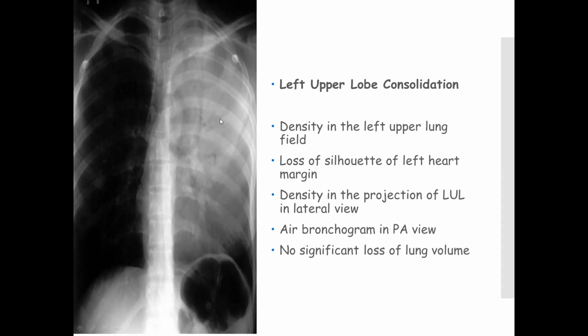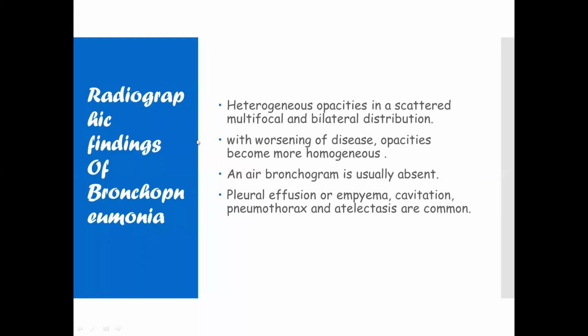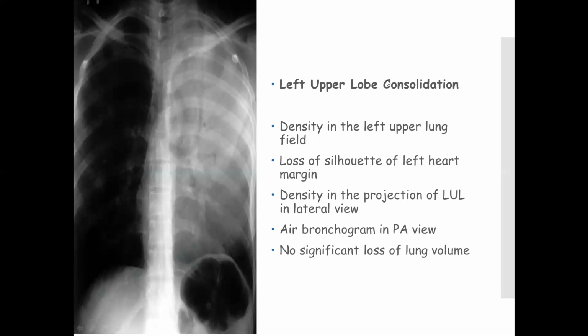So normally we're not able to see them because the lung is filled with air. But here, I hope you've appreciated the air bronchograms.